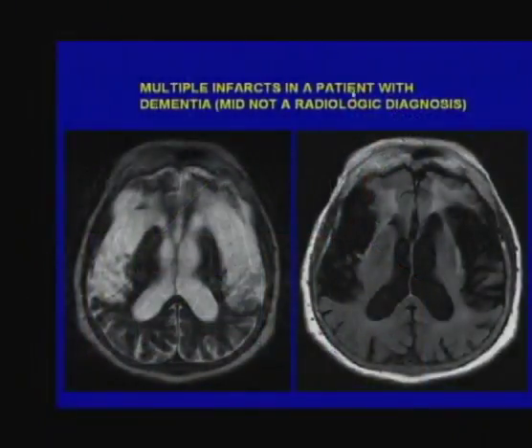Infarcts may occur without white matter disease. Multiple infarcts, especially bilateral infarcts, may be associated with so-called multiple infarct dementia, or MID. Now, I just want to stress again, we do not, as you well know, image dementia. What we image at this point in time, though probably things will change in the future, is the structure that's associated with dementing disorders.